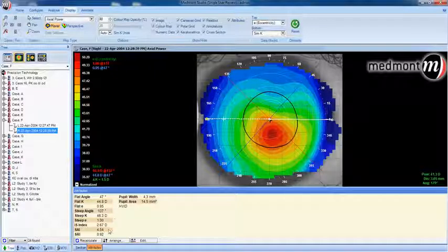and that would be deemed abnormal. Surface asymmetry index looks at the oblique axes and determines if the curvature across this hemichord is similar in shape to the surface across this hemichord. Are the two very similar to each other or symmetrical across that axis, or asymmetrical comparing one side to the other?